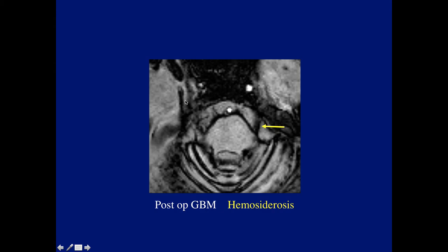Why am I showing this case? I'm showing this case because of the trigeminal nerve. But what is the condition in this case? Correct. Stefan, Eric, both mentioned siderosis. This was post-op for GBM, and notice extensive siderosis involving, you see all the sulci here, multiple cranial nerves, and in this case, markedly thickened left trigeminal.